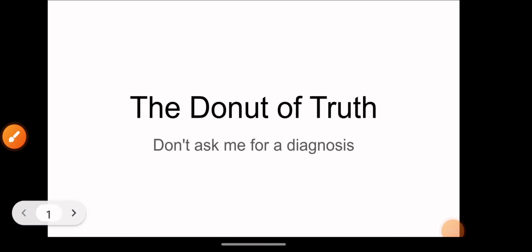So I want to just make it very clear that I often get students to look at x-rays, but I don't want them to give me a diagnosis. Just want them to phrase things in terms of anatomy and opacity. And I want them to use phrases like zone rather than lobe. And I want them to use things like costophrenic rather than, you know, sulcus sign or whatever else. So I don't like the signs that sometimes are taught, and I prefer to just use some kind of word of where the opacity is based in the anatomy.